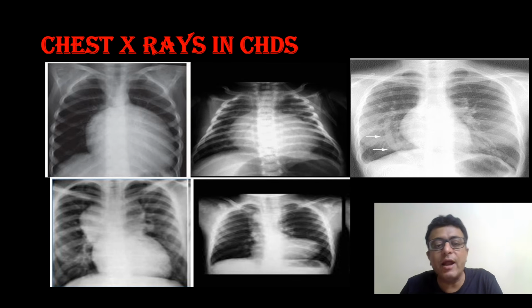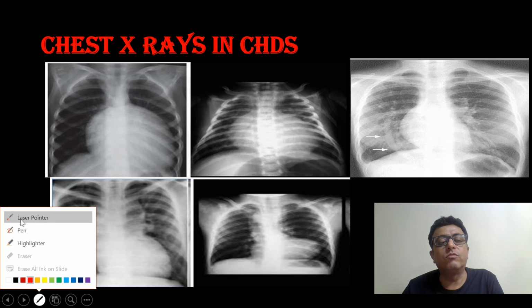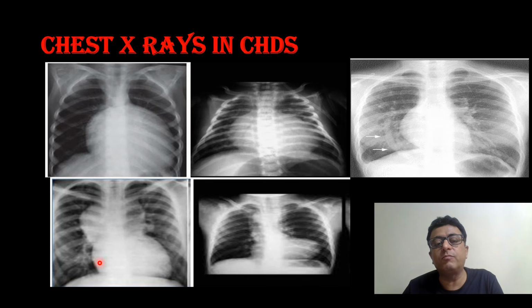The pattern now is that image-based questions come. In last year's JIPMER exam, this X-ray was there. So what this picture shows, you may get in your exam. The purpose of this short session is to acclimatize you with the X-ray in CHD.